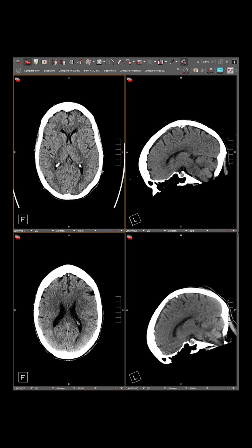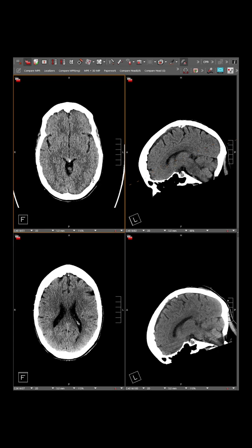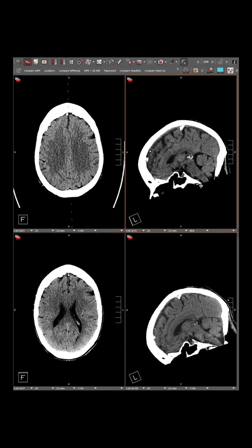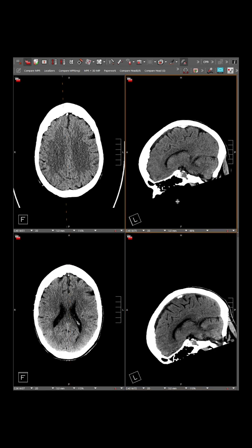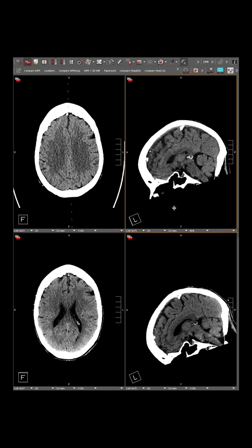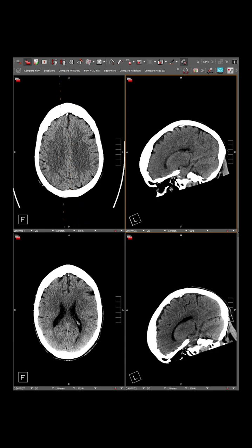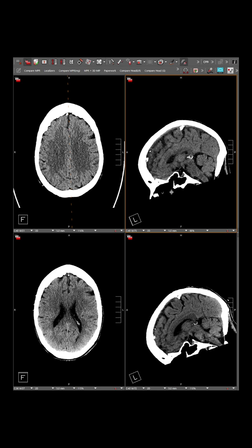Hey, so in this video, we're going to go over some key skills, some of them basic, but pretty critical to understand and be able to leverage in navigating Visage, a PACS to look at medical imaging. This is the one we use at my institution, and it's very good. It has a number of different functionalities that will often be universal, or where the skill sets or principles will be portable to other PACS. So we'll go over some key skills that will help someone who's relatively new to using Visage get oriented.